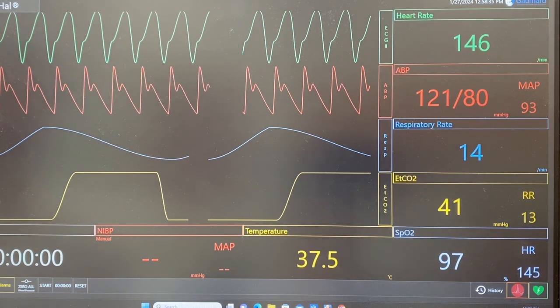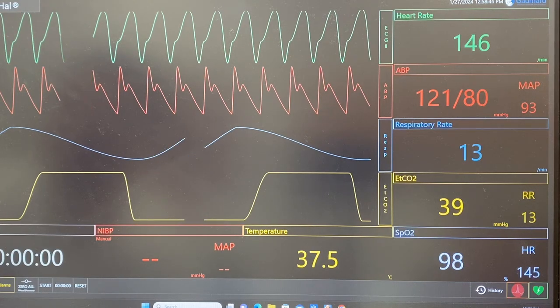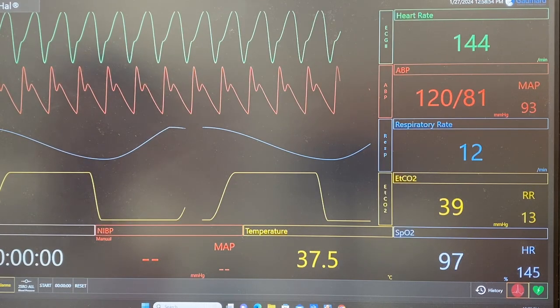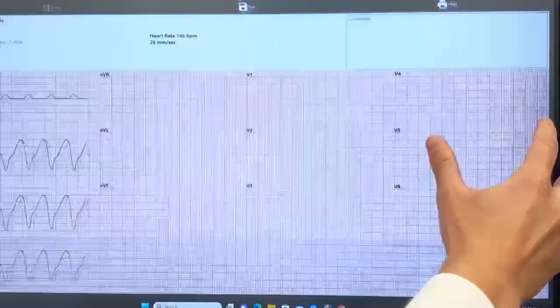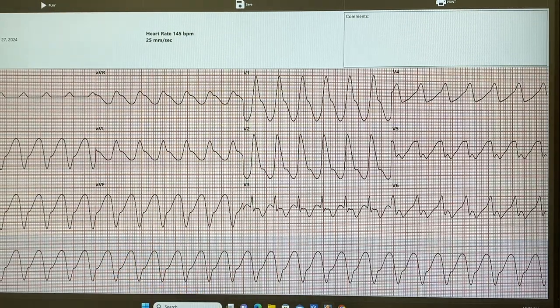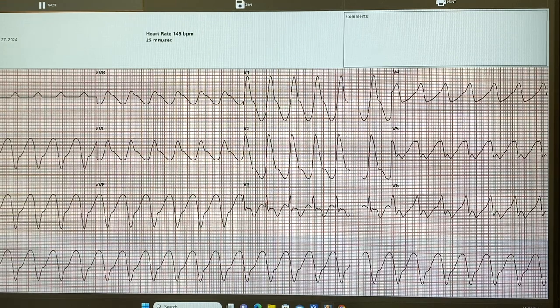Let's go. We're looking like tombstones here. Okay, so go through the motion. Looking at the telly so far, I see no P waves. Wait, back up. Okay, backing up: rate, rhythm. Rhythm and rate. So let's go here. Okay, and I can pause, correct? It'll pause automatically once it's done. Maybe play it a little bit so that you don't see that. There we go, because that was inaccurate on the left side. And then pause it when it gets to the end.